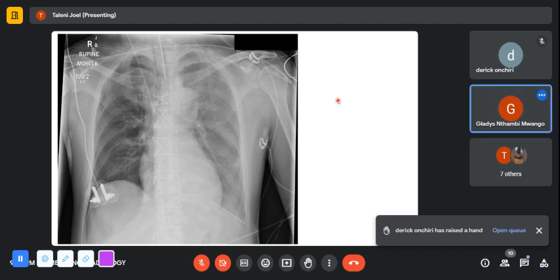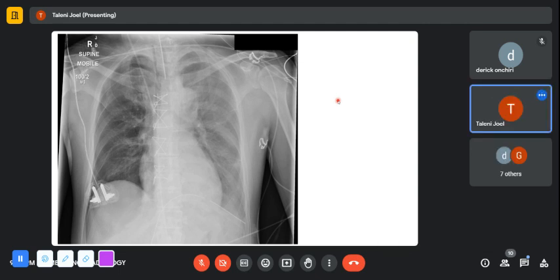Oh, is there someone volunteering? Derek? I think he wants to report the image. Yes, please go ahead. Not really, I was asking about the Mach bands. Maybe can you describe again? Well, let me just show you the image. I haven't put images of the Mach bands themselves, but I will show you the signs as we go along, or what could be considered a Mach sign.